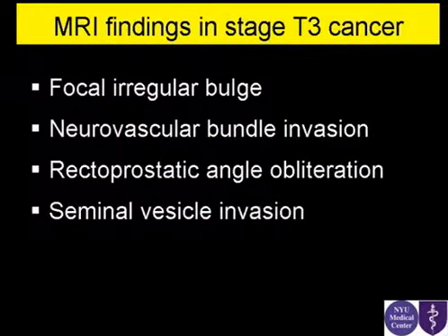So what are the MRI findings in stage T3 cancer? Again, I told you T3 means no surgery. So it's critical. If you're starting a program or starting to read prostates, the first step is really to identify T3 disease and T4, of course. And then you can go a little bit beyond that. So we're going to review all these illustrated by cases.